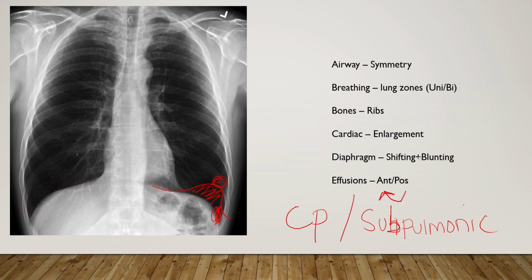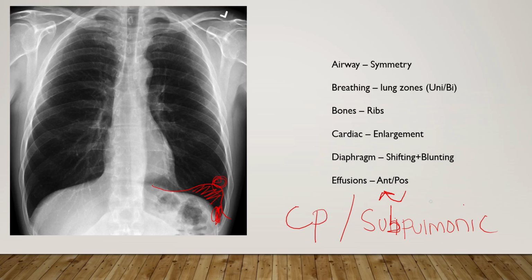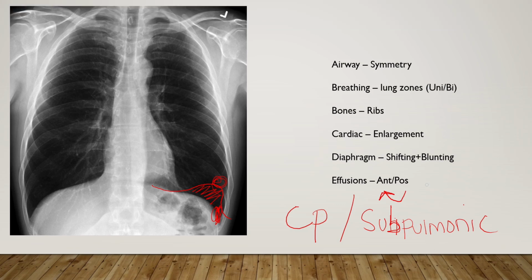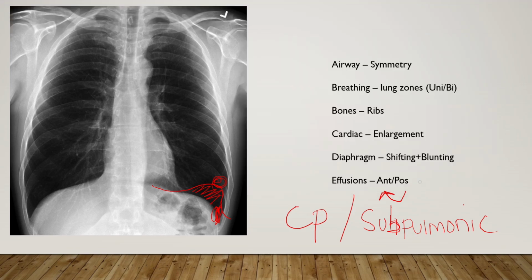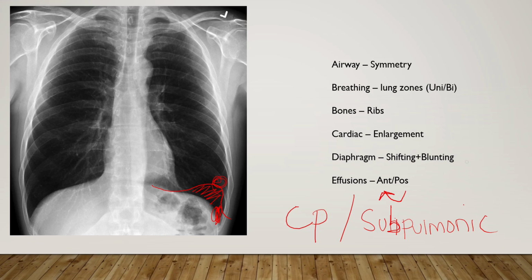Shifting, when I say shifting, I mean to do with subpulmonic shifting, subpulmonic effusion. All right. Now my pen isn't working for some reason. Come on, pen. It was actually working a second ago, but it's not. All right, forget it. So shifting, I mean subpulmonic effusion.